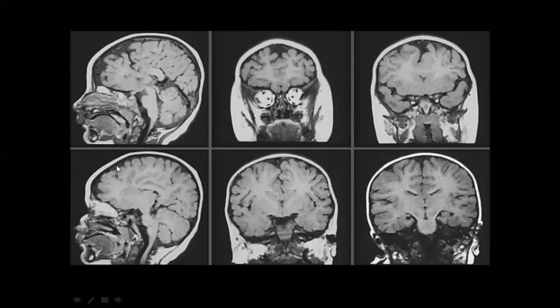Look at the sagittal image, it's easier for you. As a good approach, if you have a skull like this and this young patient, I will recommend you to look into two places first. Look here for Chiari and look here for corpus callosum. After that, look at your checklist, but start with this.